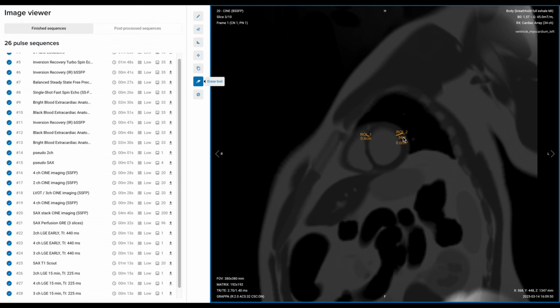There's also a third pattern, patchy gadolinium. This shows scattered enhancement in multiple regions, a little here, a little there. It doesn't follow the usual pattern of myocardial infarction. This pattern is almost never, or very rarely, consistent with myocardial infarction. It's more often seen in cardiomyopathies, or suggests the possibility of a cardiomyopathy. But these are the kinds of diagnostic considerations that clinicians, cardiologists, or radiologists make.